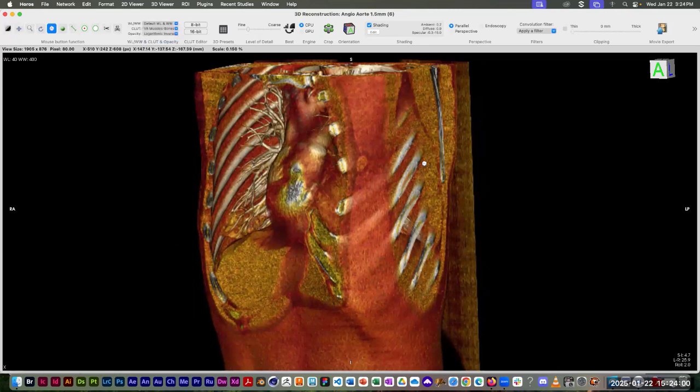Okay, so the second half of your exercise today is to open up some other data set, turn it into a 3D volume rendering. And I think I gave some guidelines, like I think I wanted you to play around with the color lookup table editor and play around with the window width, window level, maybe even crop it a little bit in some plane, and then just export another JPEG and throw it up on my courses.